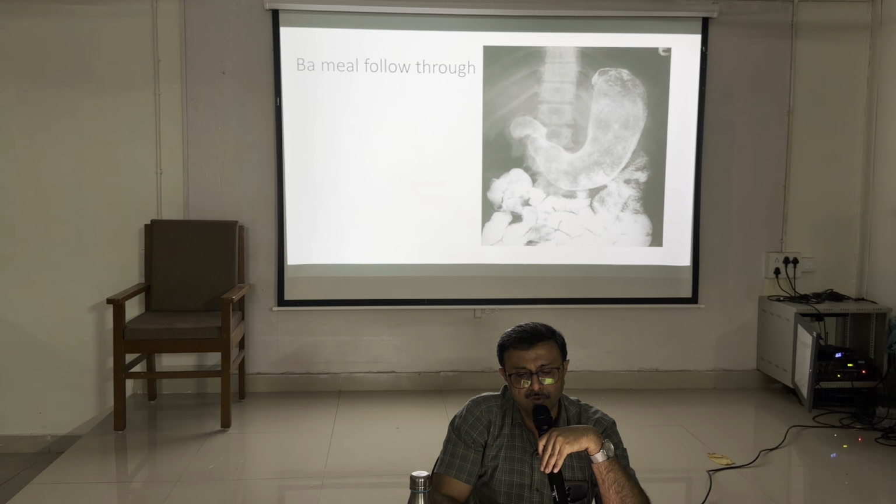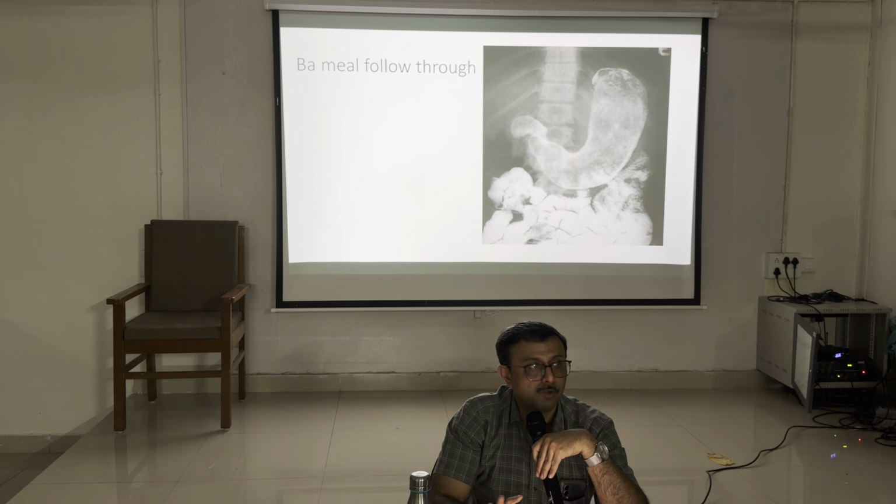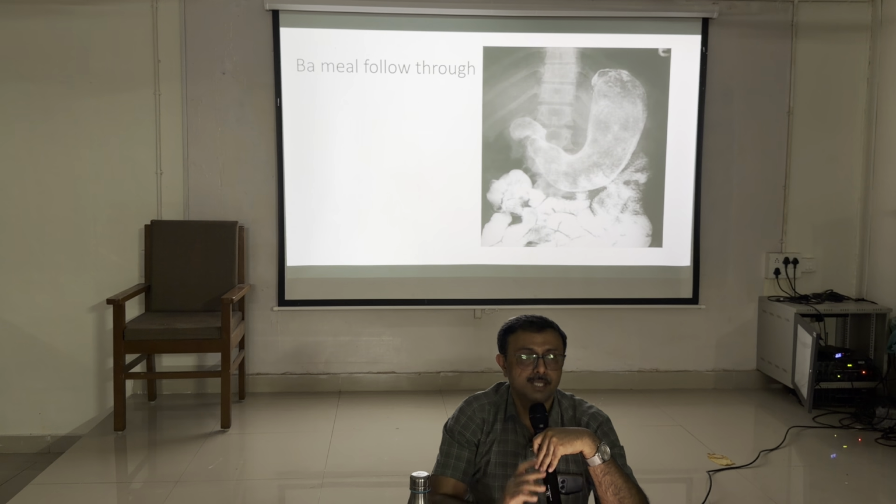These are barium meal follow-through. Barium meal follow-through for what? Small bowel and large bowel. Small bowel up to the ileocecal junction and sigmoid.